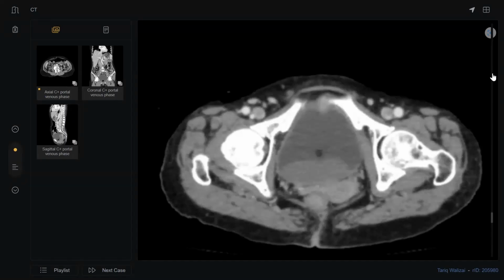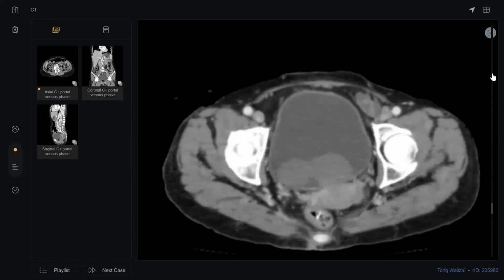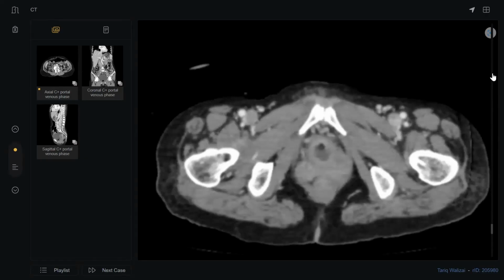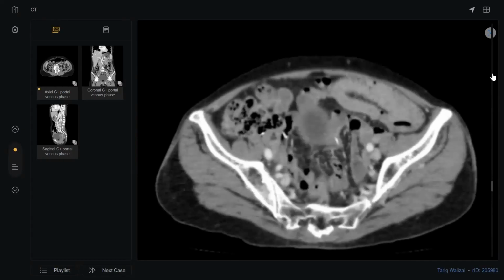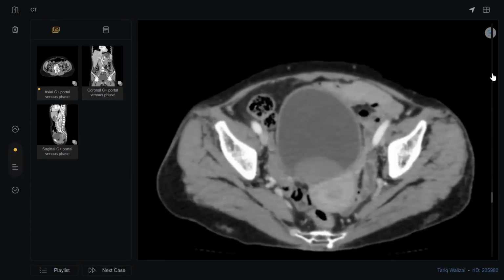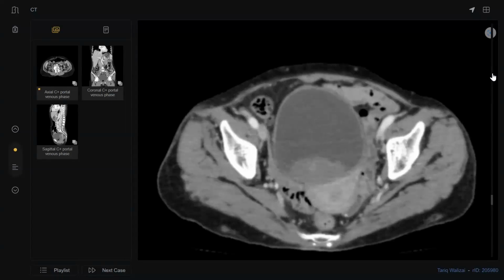In the bladder also, I noticed an abnormal area of enhancement along the posterior wall of the bladder, and maybe involving the vesicoureteric junction. There is a heterogeneously enhancing mass which has papillary type growth on the posterior wall of the bladder. Are you sure this is an enhancing mass? Faint enhancement is there. It's slightly hyperdense, it appears to be faintly enhancing.